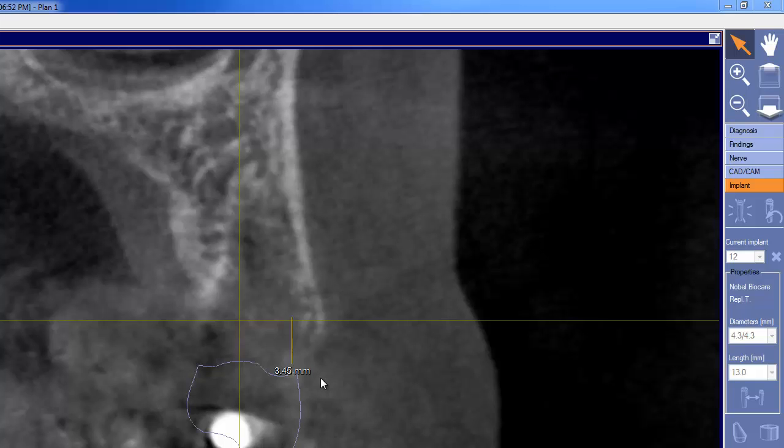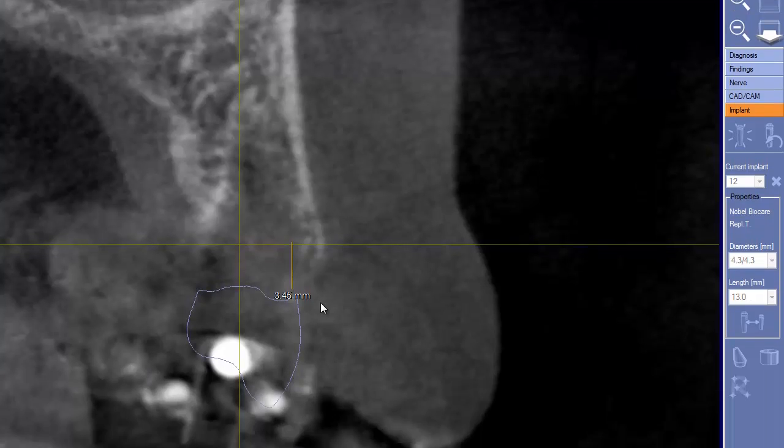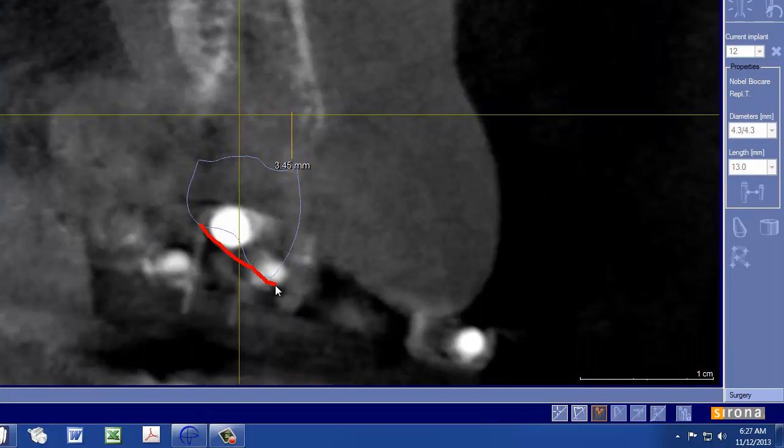The reason I'm worried about our CEREC drawing here is I see one cusp tip right here and one cusp tip right there. This just doesn't seem right to me. Again, I don't have the benefit of having seen the patient clinically, and I don't have the benefit of seeing the CEREC data. It just seems very unlikely the palatal cusp would be so low and the buccal cusp would be so long. I would question whether or not this patient is going to be moving and hitting that buccal cusp in excursive movements, if this is giving me an ideal picture of what's going on.